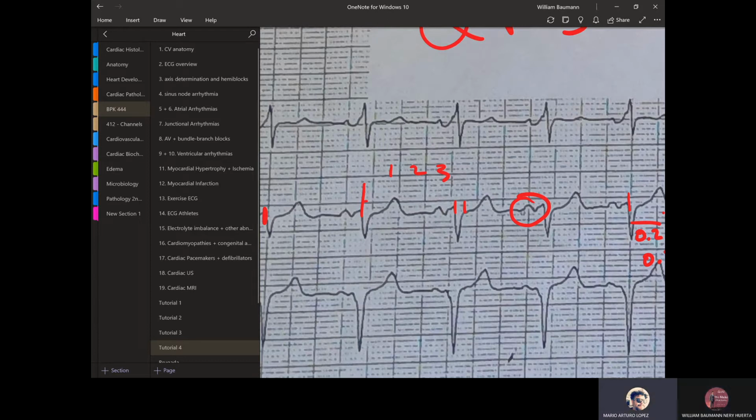You know, I think maybe it's a little widened. Hang on. Take a look at this one. This one's nicer to look for, easier to see. Yeah, I would say that it's widened. Give me a number, man. So 1, 2, 3. It's definitely 3, right? Yeah. How many seconds are those? 3.